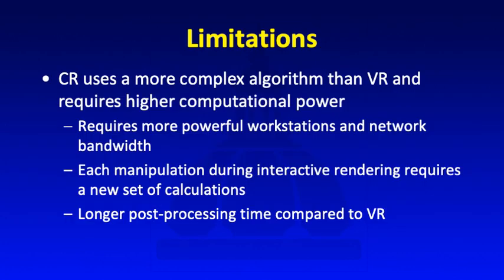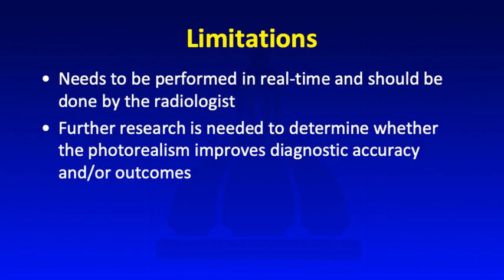Cinematic rendering currently uses a more complex algorithm than volume rendering and requires higher computational power. Therefore, it requires more powerful workstations and network bandwidths. Each manipulation during the interactive rendering requires a new set of calculations, and it takes longer post-processing time compared to volume rendering. And at the current time, it should be performed in real time and done by the radiologist who knows exactly what the pathology is and how to communicate that to the referring clinicians.